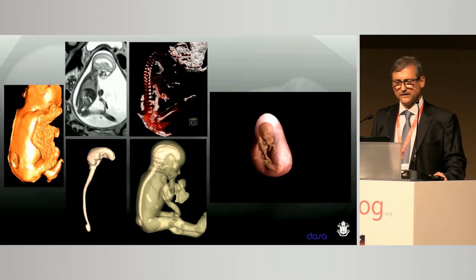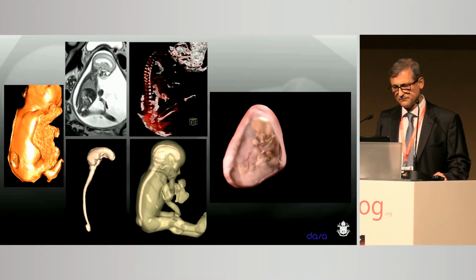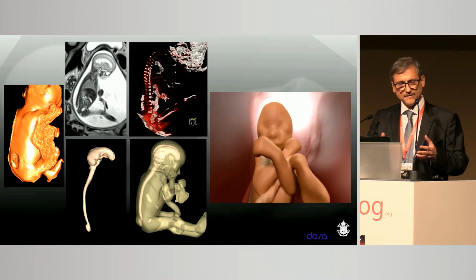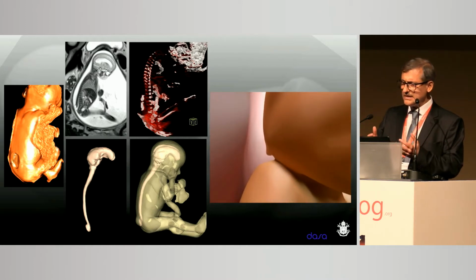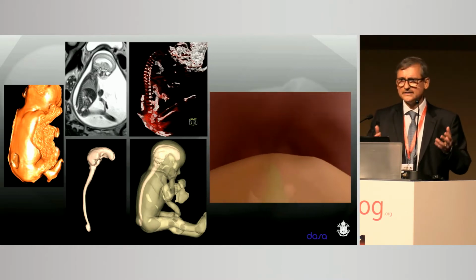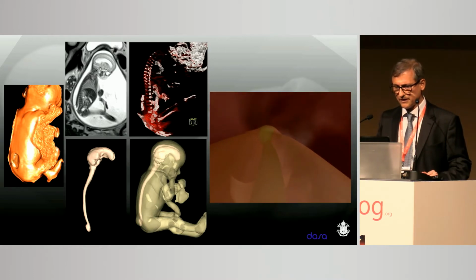In the example here, we can reconstruct. Here you have the reconstruction in Chiari malformation by MRI. So I can reconstruct the model, and I can navigate inside. It's the way for students and professionals to see in 360 degrees. So you put the glasses, it's the same as you are inside the uterus. So you can navigate, you can see around, and you can see everything.